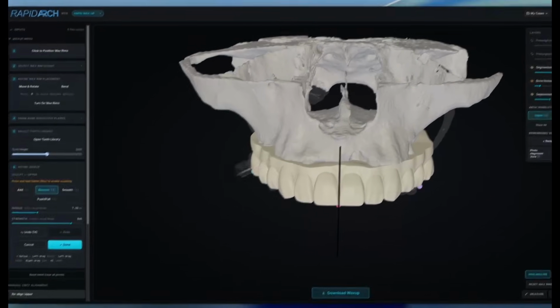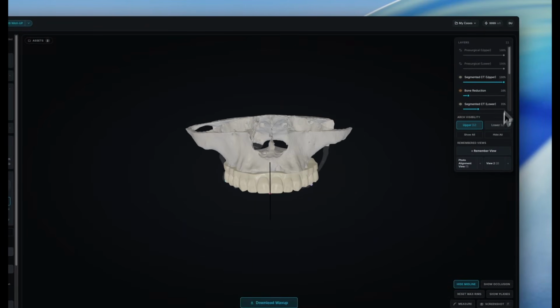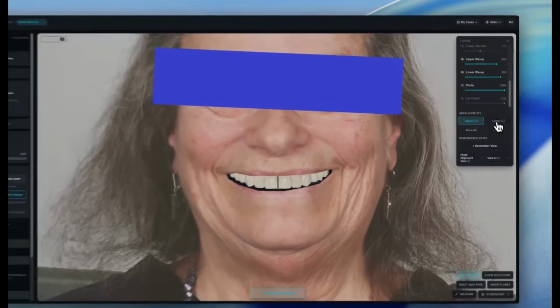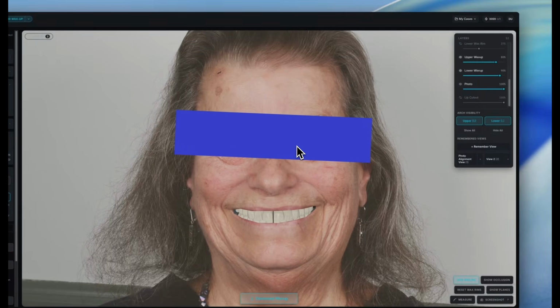And there we have it. This is just about 15 minutes. I expect people that are newer to this to take about 30 to 45 minutes or so. Still much faster than with other CAD software. But as you guys practice more and get more experience, this should start to become super predictable.